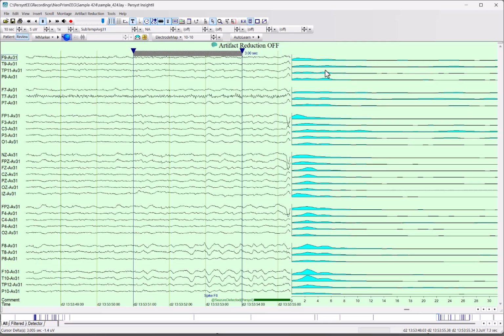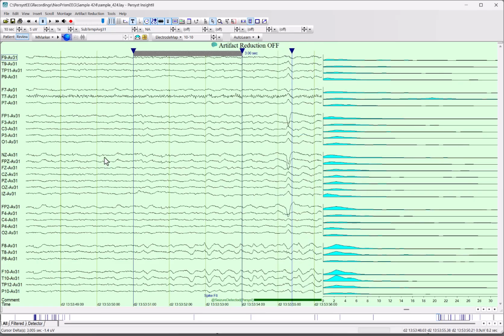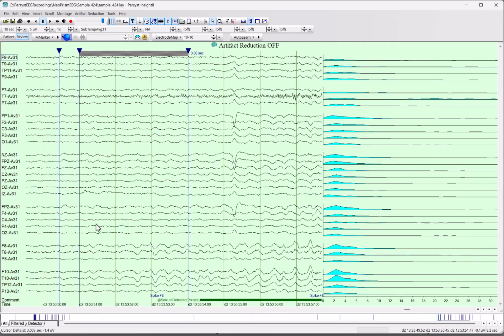So to do that, this is where this right-click menu is going to come in handy. And note that something that may not be obvious is, between the waveform display and the FFT, or whatever the graphs are that you're displaying, when I put the mouse between them, it becomes a 2-headed arrow, and that's for resizing. So if I click and drag, I can resize that. If I click and hold on the EEG, it becomes a hand symbol, and I can move the EEG over as well. Notice that range stays where I put it.